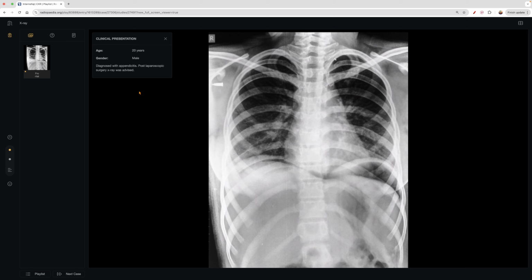and what this ended up being is pneumoperitoneum, right? There's air in the abdomen, air rises, and this is how you can see that, it's right below the diaphragm. And the clinical history, this is so beautiful, right?